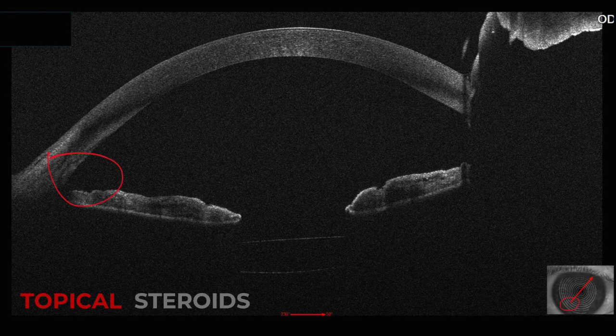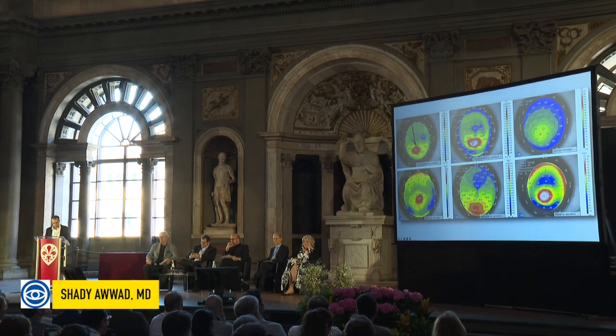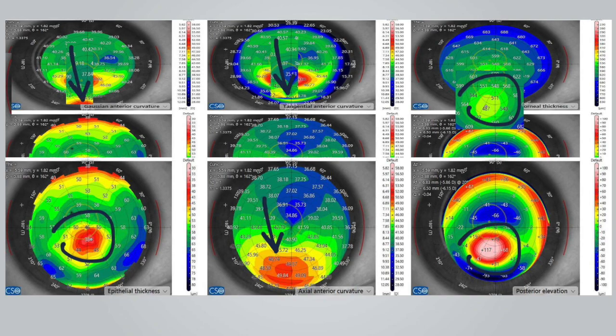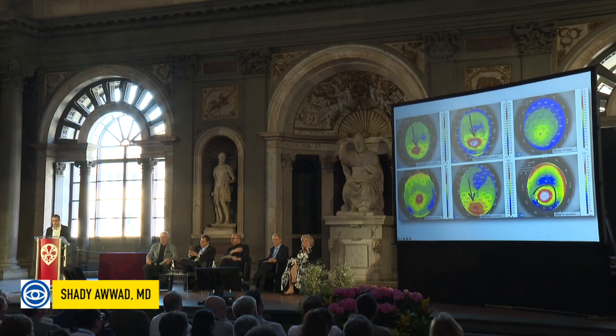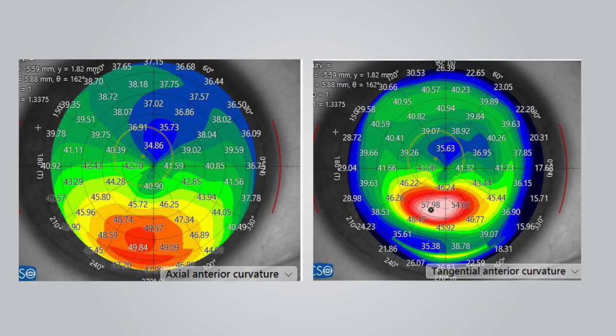And finally, quickly, just a few slides to end, always look at all the maps and look at the Gaussian maps. Look at what happened here. This is the axial. You see how far away? Look at the tangential and look at the Gaussian. The elephant in the room is the axial, way out, and it will give you a wrong idea where the cone is. You can compare them all together and you can see. So always do not use axial, okay?